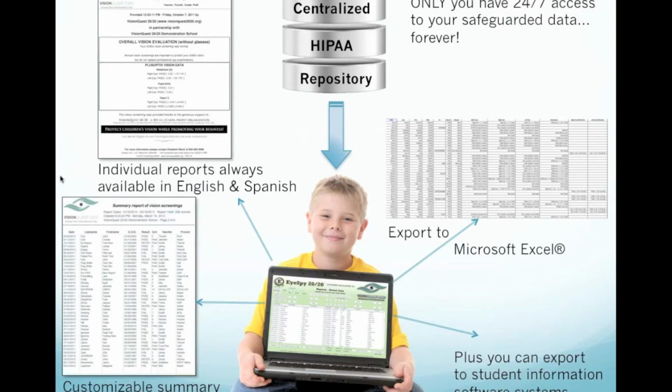And we're going to continue to develop more, as the demand requires, we will develop more and more exporting. Just to let you know, when you export into Microsoft Excel, from Excel you can pretty much import into any student information software system anyway. So it's just if there are specific requirements that the standardized export to Excel that we offer does not handle, then we would develop a customized solution.